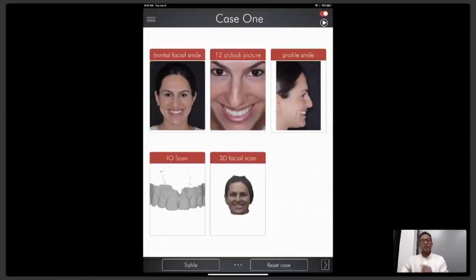So here we have one patient and you can use it for different scenarios. If you are planning on doing a full mouth rehabilitation, of course, we will also use our dental knowledge and our dental experience along with the DSD app. But if you are planning on doing full mouth rehabilitation, I recommend you to use the full DSD pictures and video protocol along with the STL.